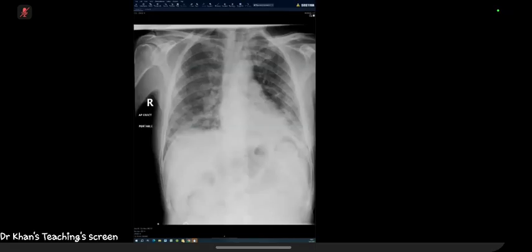Have a go at this one. So the patient is a 78-year-old, increasing cough over the last 2 weeks. Okay, I am presented with a plain X-ray of a 72-year-old male with cough for the last few days.